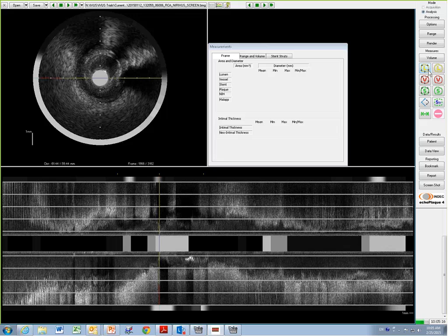But I bring some series of cases, which is something like this. Some of them are super obvious. It's huge. And this, I think, is a kind of borderline artery, where you decide not to include, but others possibly include. So for those borderline vessel sizes, I bring some series, and then we can discuss all together, and then we are more comfortable on the same page about not including or including. So we do it at the meeting next week.